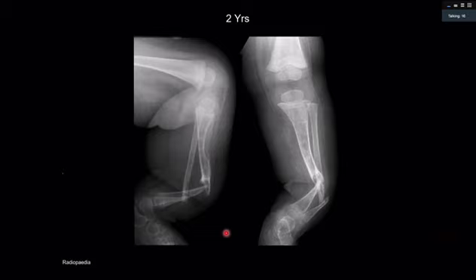I'm trying to look for soft tissue nodules seen throughout the soft tissues. On closer inspection, I can see there are a few soft tissue. No, not here. So don't worry. There is nothing in the soft tissues in this case. This particular entity, how do you describe it? You know what happens in neurofibromatosis. So that's why I've confirmed your diagnosis is correct. But you tell me why.